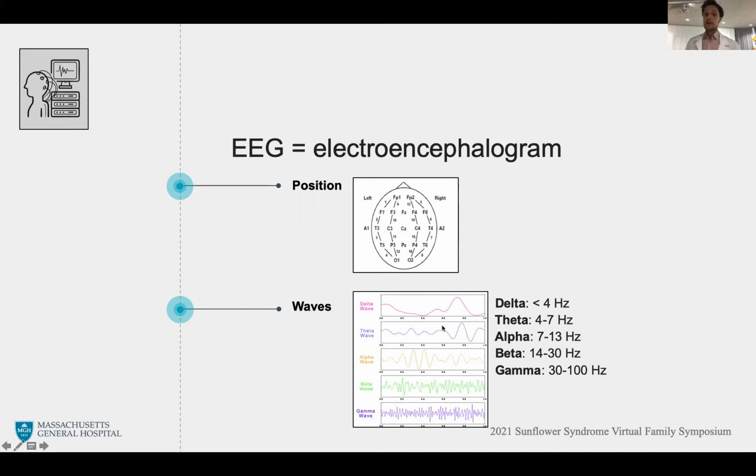If we now focus on this signal, there are different activities depending on the frequency. For example, how many times does the signal go up and down in a certain time frame, in 1 second?